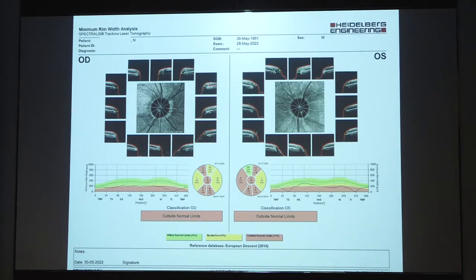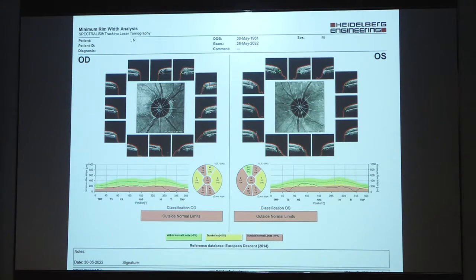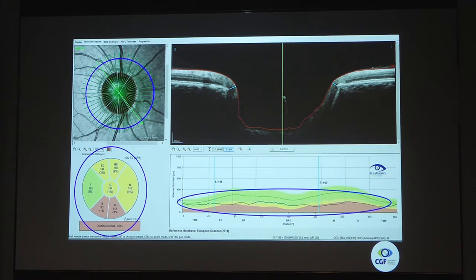How we really look at that in a clinical way is that the printout comes like this. Most of us are used to the printouts, but what we do in our OPD is mostly look at the screen directly from the machine. That is the best way that you can really see. But this is another way you can see the printouts, but we'll just go step by step. When you see it in the machine, there are 4 zones to be seen. We'll just take you through that.